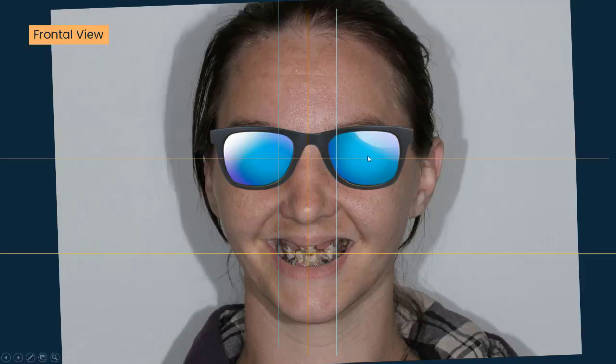There's always a little flash point in the pupils. I'll try to position the picture so that the line goes right through the same spot in both pupils. And then this is a duplicate of that line, which I can drag up or down, and it gives me that interpupillary plane down here in reference to the teeth. And oftentimes I'll drag that down to where maybe I want to put an incisal edge.